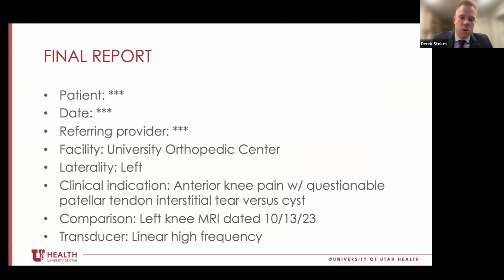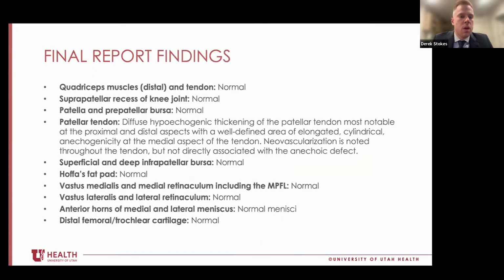We have a comparison with the left knee MRI, and then our transducer selection, which was the linear high-frequency transducer. I'm not going to go through all the normals that we called again. However, like I said, we spent about 4 slides looking at the patellar tendon because there was so much going on. So we have to find a way to summarize that. So this was our description here.